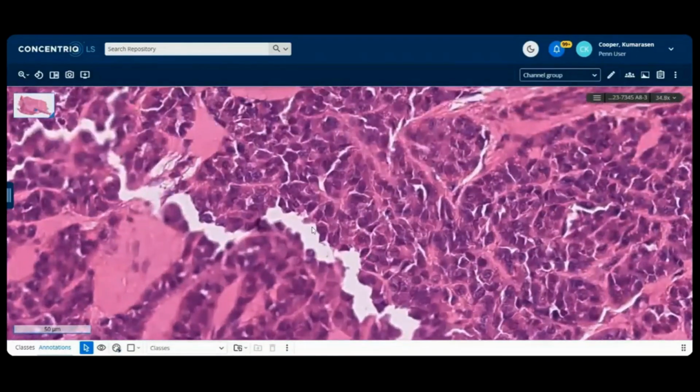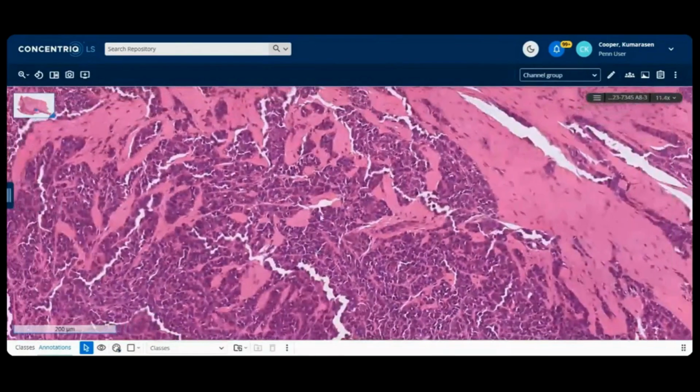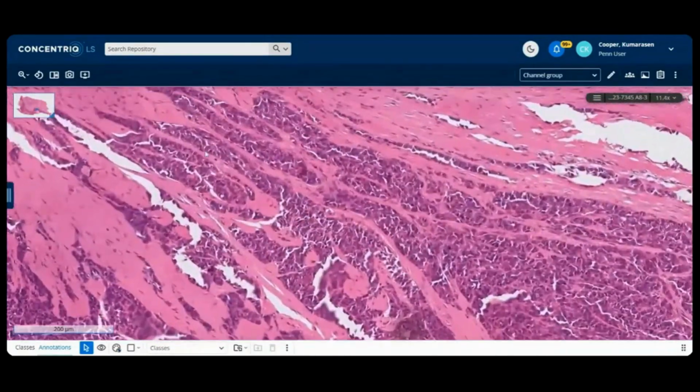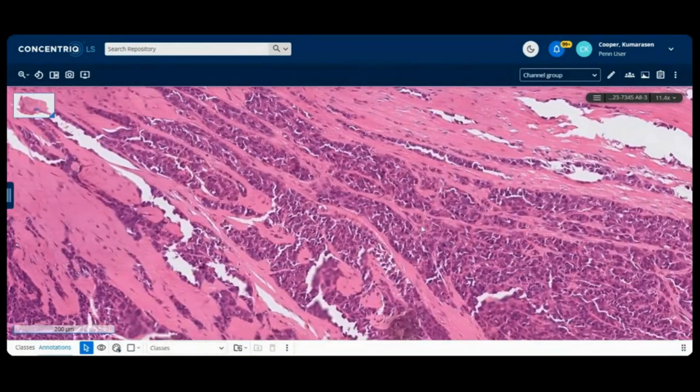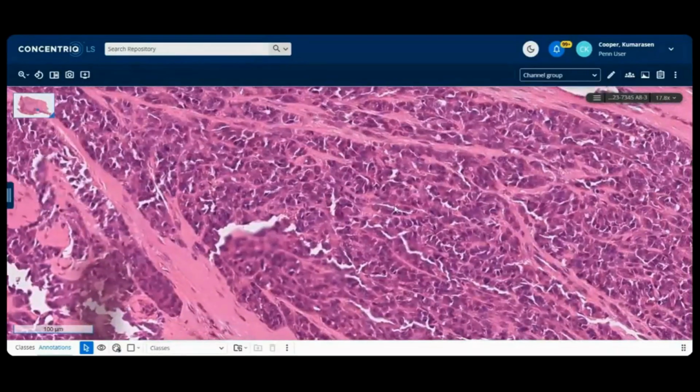And yeah, as we go down, you can see again, this might be a little thick, and I apologize, but the cytoplasm is eosinophilic and forming these cords and nests, background of collagenous stroma. Here again, just this trabecular pattern. Okay, so just to remind you, we're looking at medial surface of the foot, tumor that's 11 centimeters and does grow into the bone.